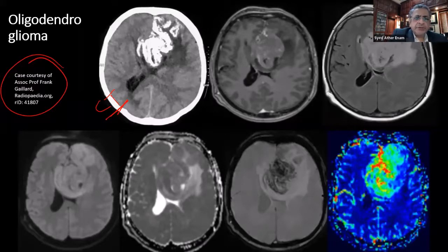Now notice that when we go to the MRI, we do not see the calcification dropping signal so much. So don't expect it like in bone, you don't see that in here, right? But then you do see some, and when you get to the susceptibility weighted image, that's when you will see the signal drop out, significant drop out.